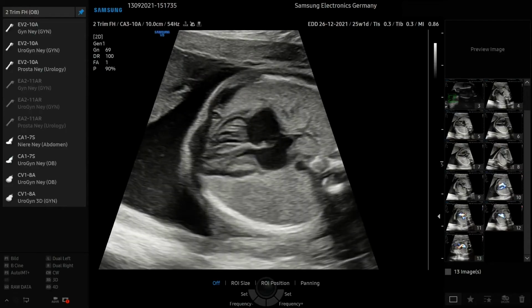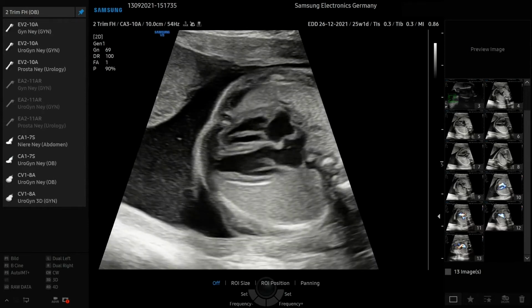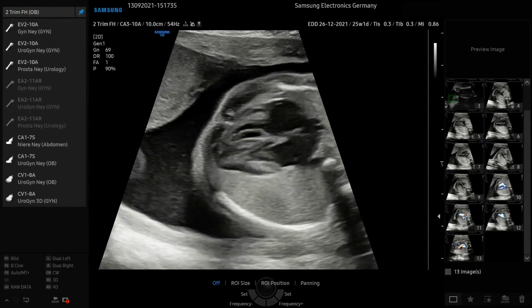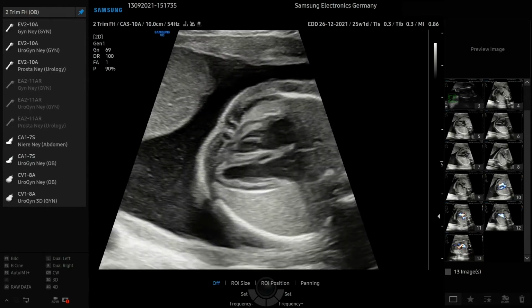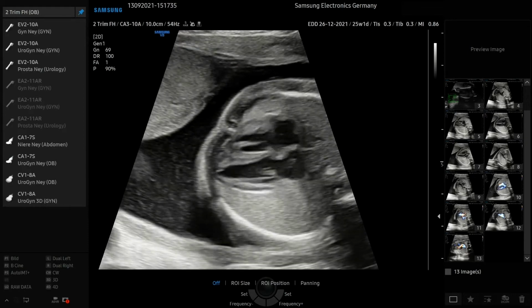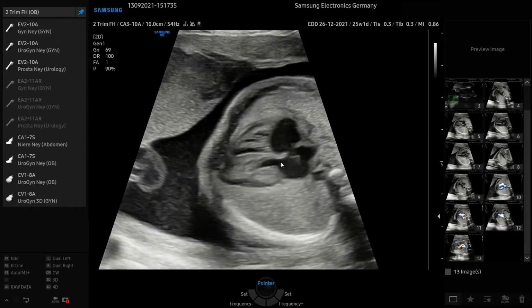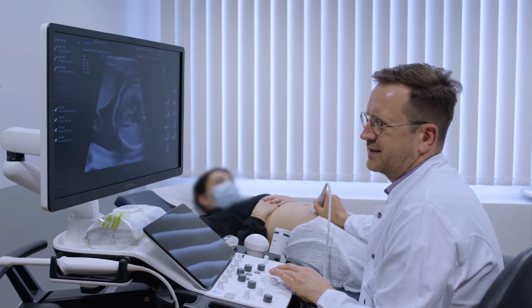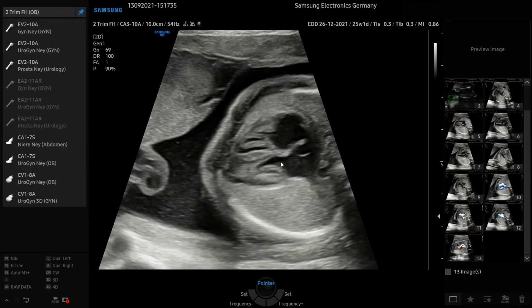Going back to the lateral four-chamber view, you see again the integrity, and you can see how the AV valves and the papillary muscles insert, and this is very, very important, and this determines the left and the right ventricular origin.